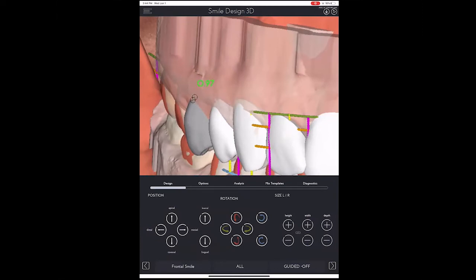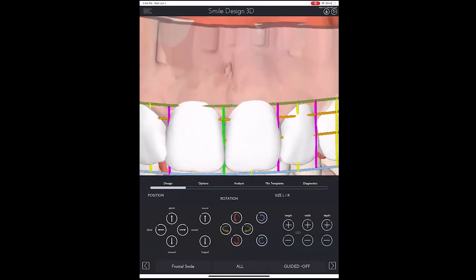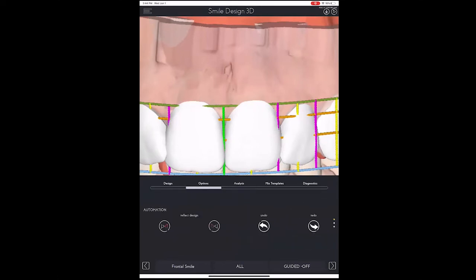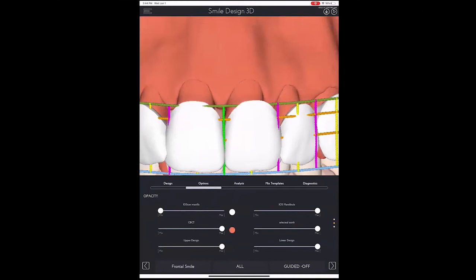Here, for example, in this premolar, I have about 1 millimeter. So for sure, I would need to increase another 1.5 to 2 millimeters in order to deliver proper biological width in those areas. Now, if I look here from the central, for example, notice that the patient's bone crest is much higher.